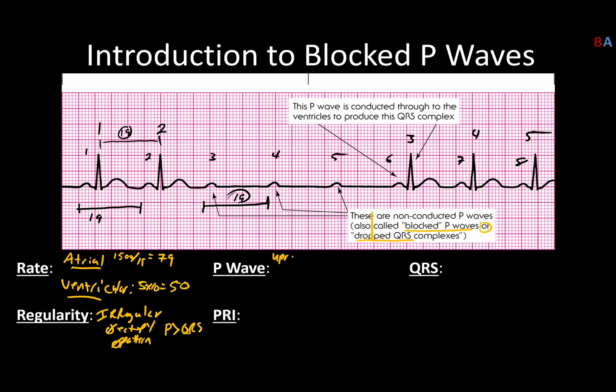They're upright. They're regular. I've got more P's than QRS's. In fact, I've got 3 blocked P waves, but the P waves are regular.